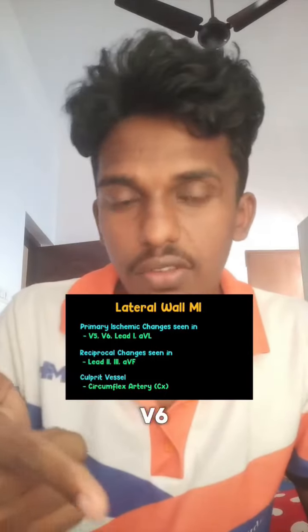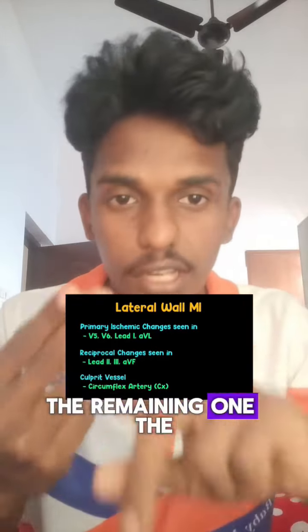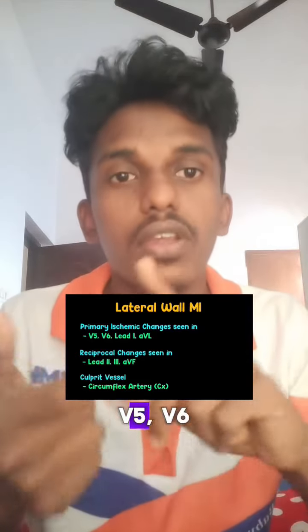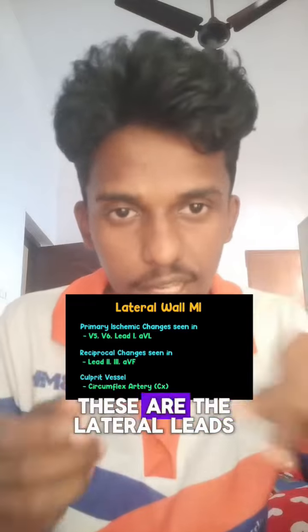So V5, V6, 5 plus 6, 11. The remaining one, lead one, and then this is lateral wall, L, AVL. V5, V6, lead one and AVL. These are the lateral leads.